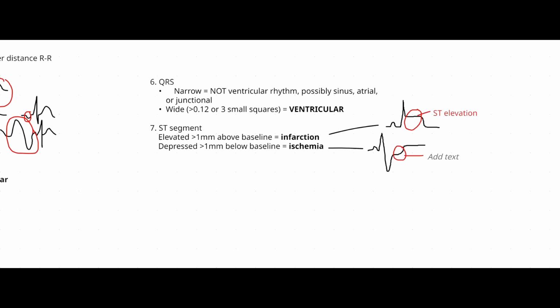So again, if someone, let's say, was doing a treadmill test and we see this, then that tells us there's a blockage in the coronary artery, but it's not a full blockage. And when they're under stress, because of high blood pressure, it closes up, right? But then when they rest, it opens up again. So that's coronary artery disease.